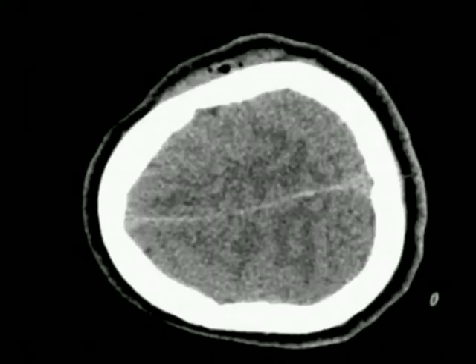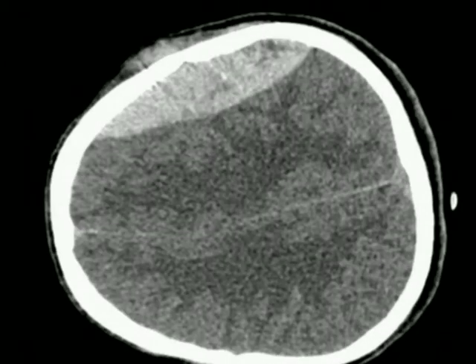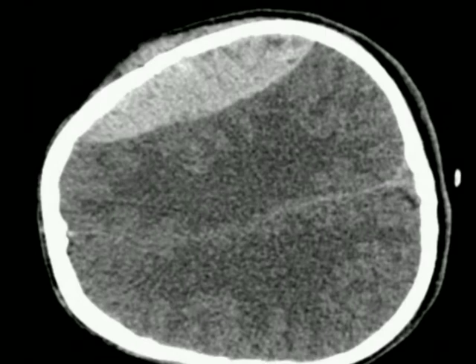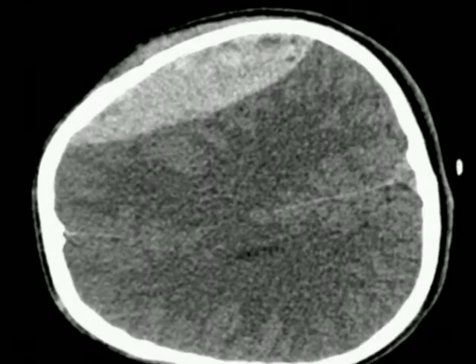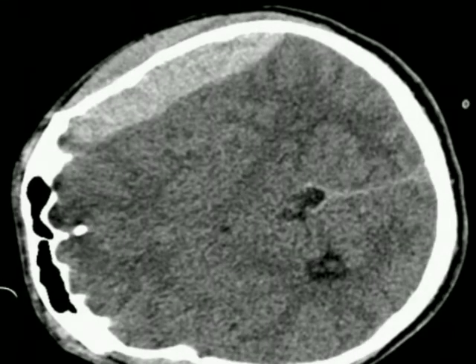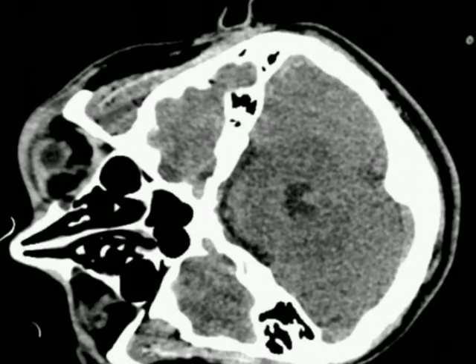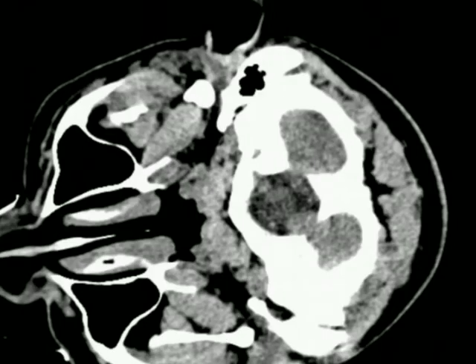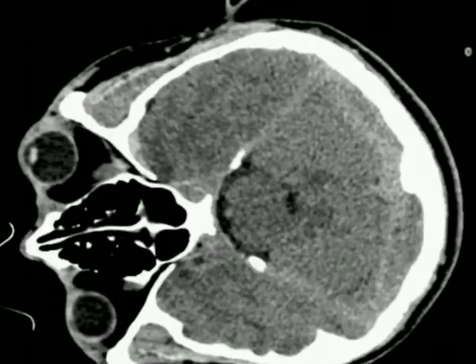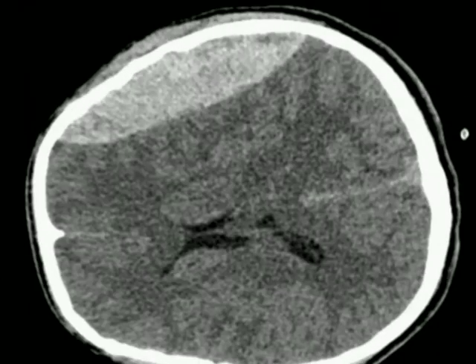This is a scan of an extradural hemorrhage. Working from the top of the skull down, we can see again a hyperdense lesion on the patient's left. Compared to subdural hemorrhages, the bleed has more of a convex shape. Extradural hemorrhages tend to happen more in younger patients with significant head trauma, and the bleeding tends to arise from a torn artery, usually the meningeal artery, and quite often there's an associated skull fracture as well. We can also see some evidence of midline shift on this scan.